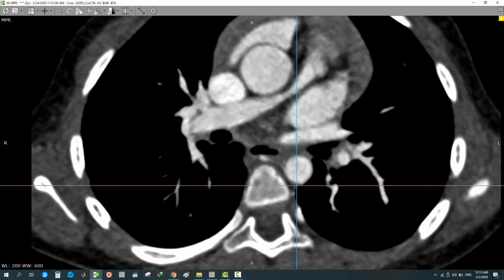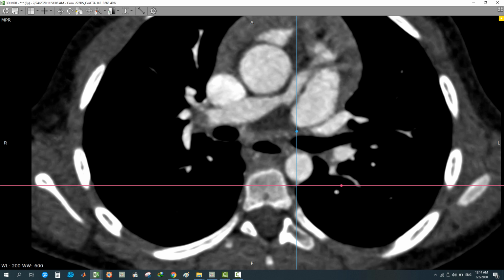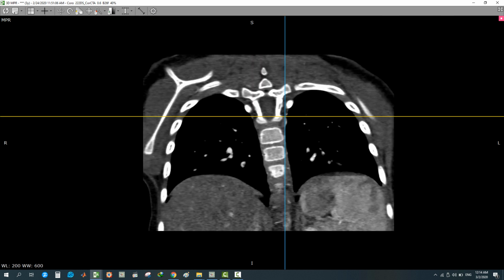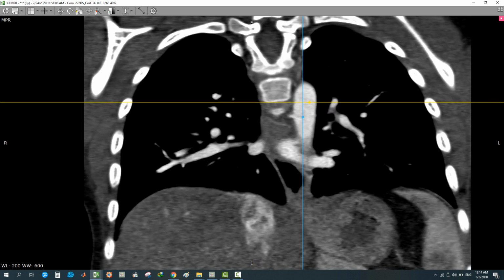Any vessel, as you see, this one like this, trace it to its end. Okay, MAPCAs should end in the lung hilum, either right or left, and maybe its differential diagnosis is hypertrophied bronchial arteries. But MAPCAs, if more than 3 mm, it's not hypertrophied bronchial arteries, it is major aortopulmonary collaterals. And if it shows a tortuous course in the coronal, for example, ascending limb, then bending, and then descending, it is MAPCAs, not bronchial arteries. But this one, I think it's mainly hypertrophied bronchial arteries.